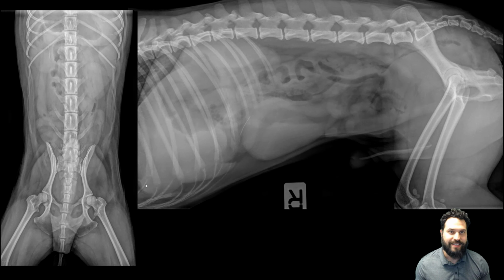In this instance, what I think is happening is that this has migrated at least partially into the peritoneal space. The thing that's telling me that is the cranial aspect of the wire. The more caudal aspect here really looks like it's superimposed with this intestinal segment. We can trace one margin of the intestinal segment here and another margin over here. You can see the intestine turning there.